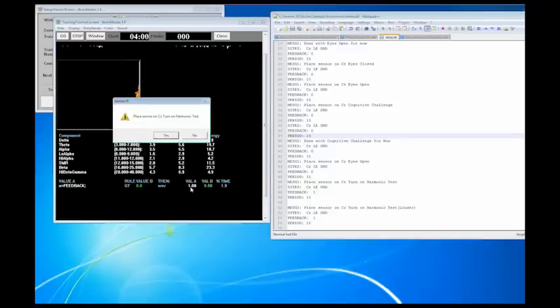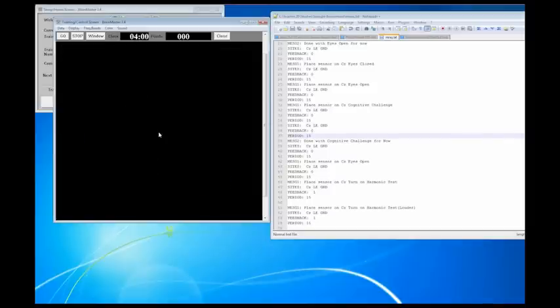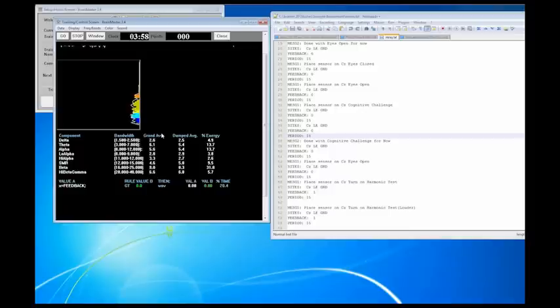There it is. You see how now value A is a 1 as opposed to a 0 like it was this entire time. Value A has now been turned on. So now we're going to play our wave sound. One of the things we built in for the Swingle assessment is it basically turned one of our basic wave sounds into a harmonic, I believe. So now it's going to be playing for that full 15 seconds.